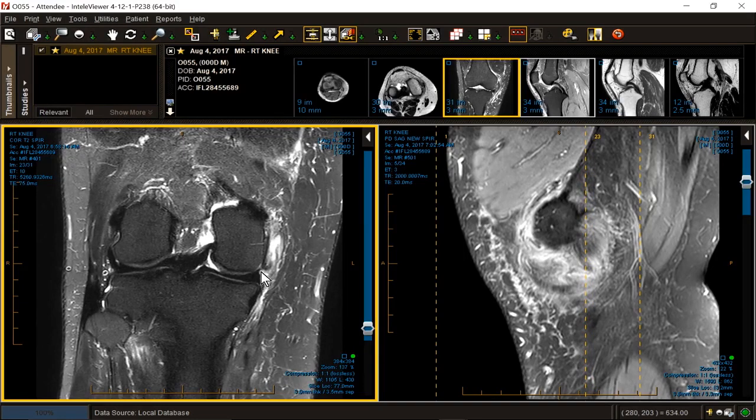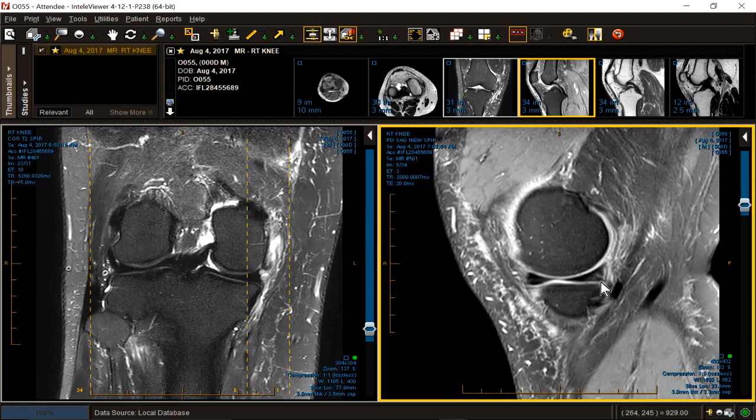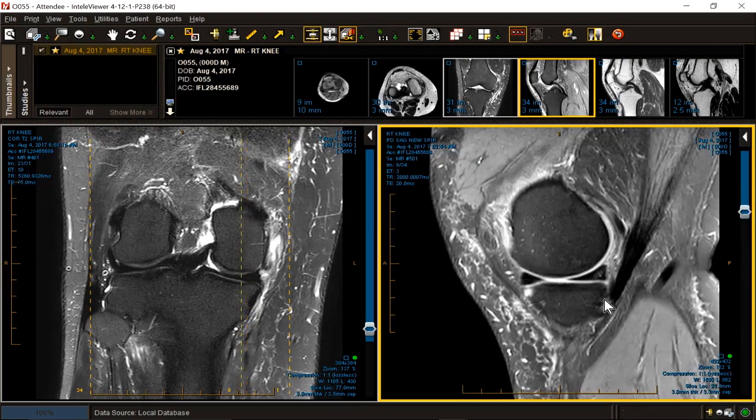That is the POL, the posterior oblique ligament of the posteromedial corner, hanging on by a very, very thin thread. But the rest of it, detached. That's a meniscocapsular separation, nearly complete. And that is what all this posteromedial corner swelling is about. The principal direct head of the semimembranosus, swollen but intact.